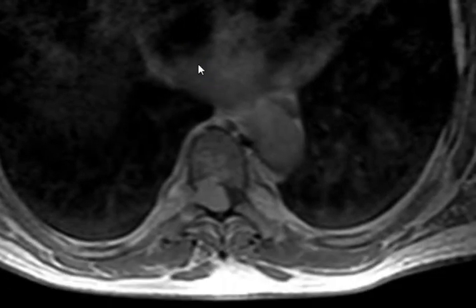Now, what do we see here? First, we see an enhancing lesion, markedly enhancing. Extradural, or dural based at least. It's dumbbell shaped. It's squeezing through the exit foramen into the paraspinal region, right?